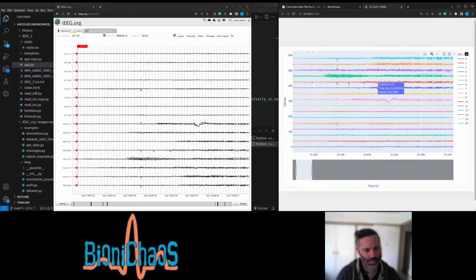If I keep them in the same order, the names should change.